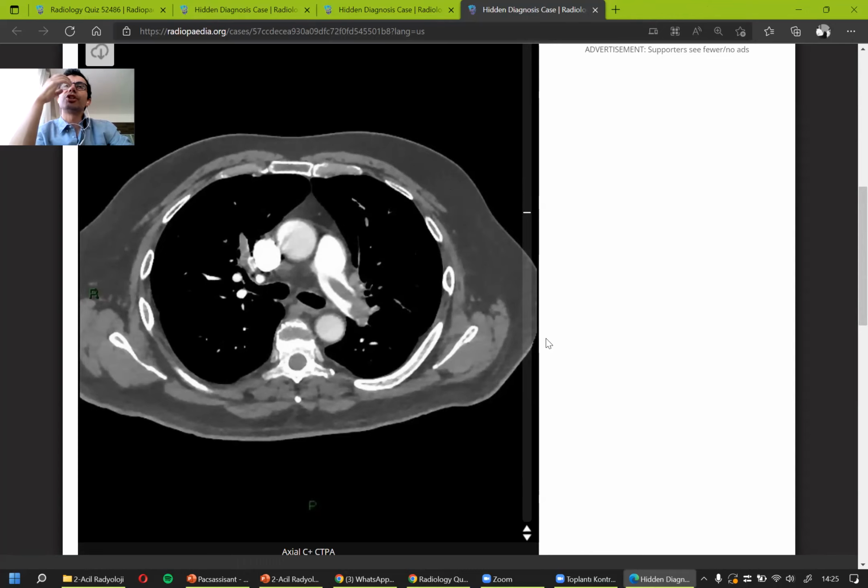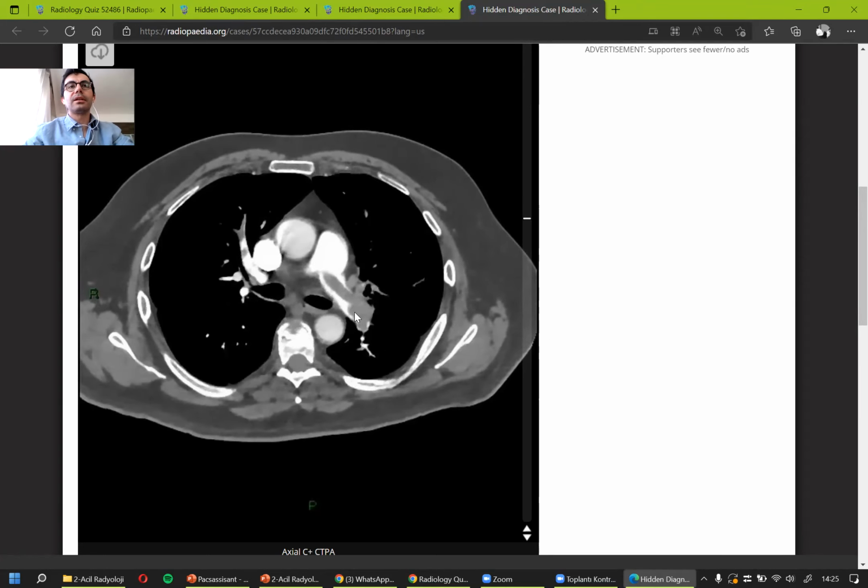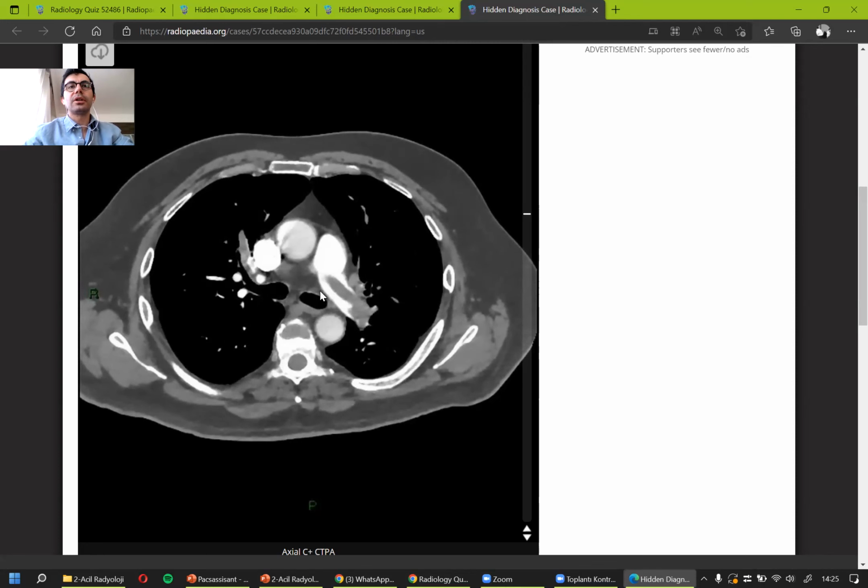I'm actually trying to ask about the shape, why it is straight. Does it mean that blood isn't reaching that area? Inside the blood vessel, we are inside the blood vessel here. So all these shining areas are contrast media. Is it because it's blocked? Yeah, it's obviously blocked. But why is something straight blocking up the arteries? Why are they not round?